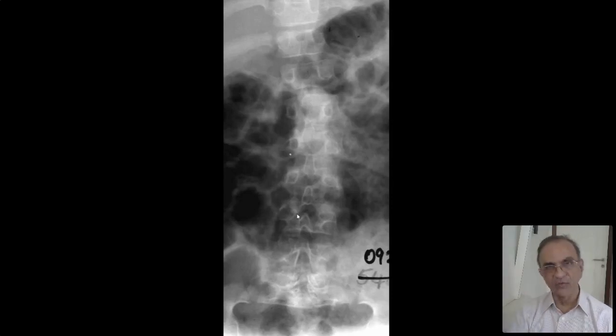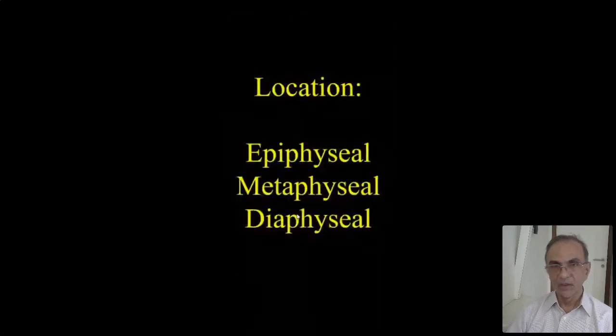You don't have to look at the whole of the rest of the skeletal survey to make that diagnosis of achondroplasia. The question would be not whether this is achondroplasia, as I said, it will be a clinical diagnosis, whether it is hypochondroplasia or achondroplasia. In hypochondroplasia, whatever that means, you don't get abnormal interpedicular distances. That is normal. So phenotypically, achondroplasia and hypochondroplasia can look the same. Their outcomes are completely different. But radiologically, interpedicular distances are abnormal only in achondroplasia.